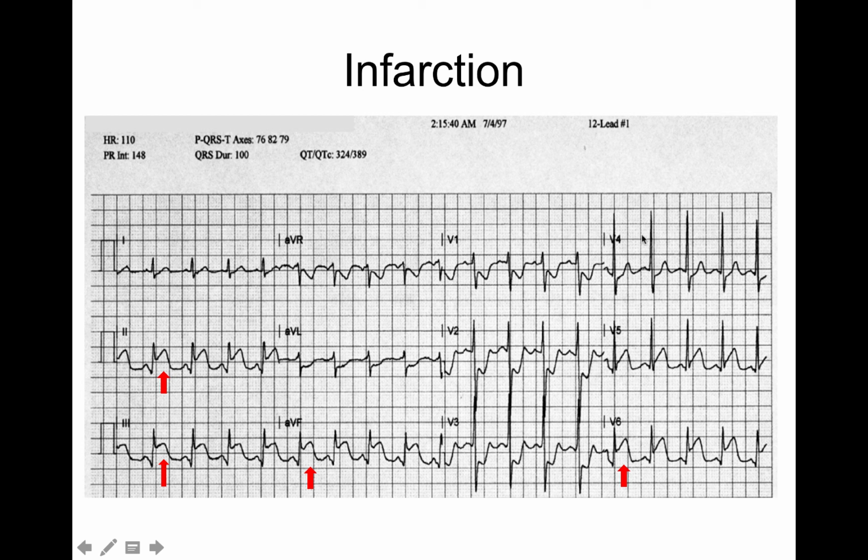V3 and V4 correspond with each other. V3 is ST depressed, however V4 is not. So I cannot say by clinical definition and rules that they are also having ischemia to the anterior portion of the heart. Lateral portion of the heart, not too bad. However, one thing that I do notice that brings up my attention, I do have some ST elevation here.